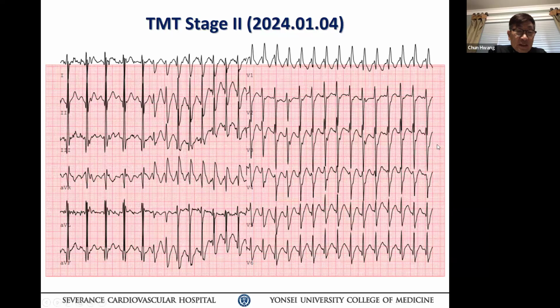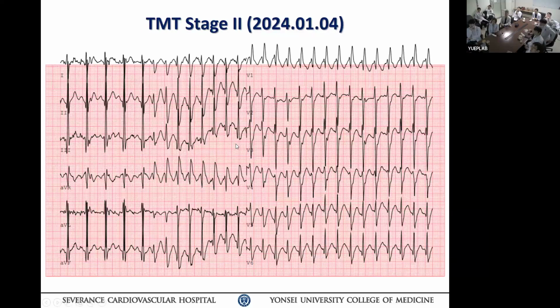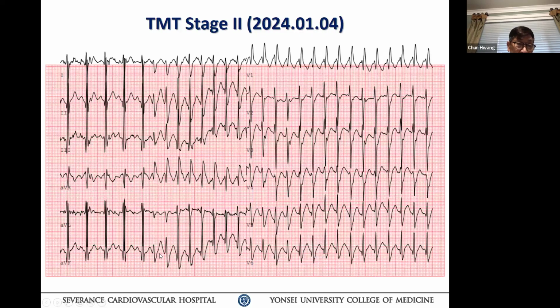네. 근데 그 beginning of tachycardia, onset of tachycardia 돌아가세요. treadmill onset. 좀 그 전에. Yes. 여기 좀 보자. That's one. Yes. What do you see here? sinus tachycardia 다음에 뭐가 와요? Rapid. Is the same as tachycardia?